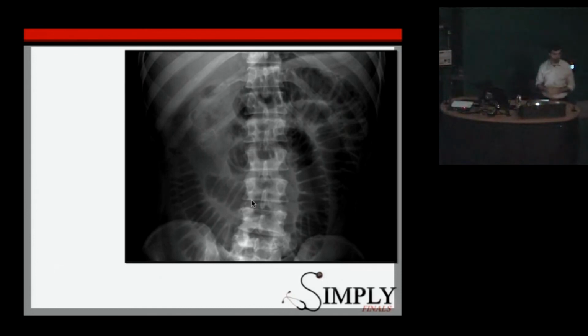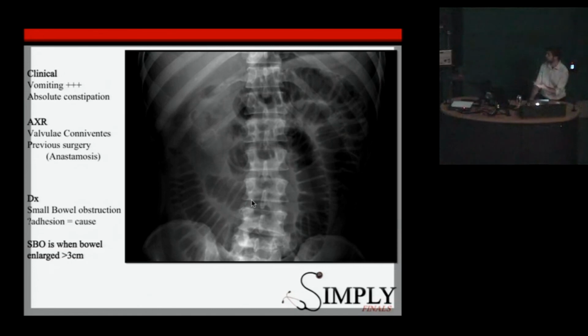And if I gave you the clinical scenario, most likely obstruction. Small bowel obstruction. So very good. Again, the initial bit of your introduction, who it is, where it's done, when it's done, stays the same, and a reasonable quality film, and then the main abnormality of small bowel obstruction. You can go on then to talk about, we'll just quickly mention, small bowel is when it's above 3 centimetres. Large bowel is above.